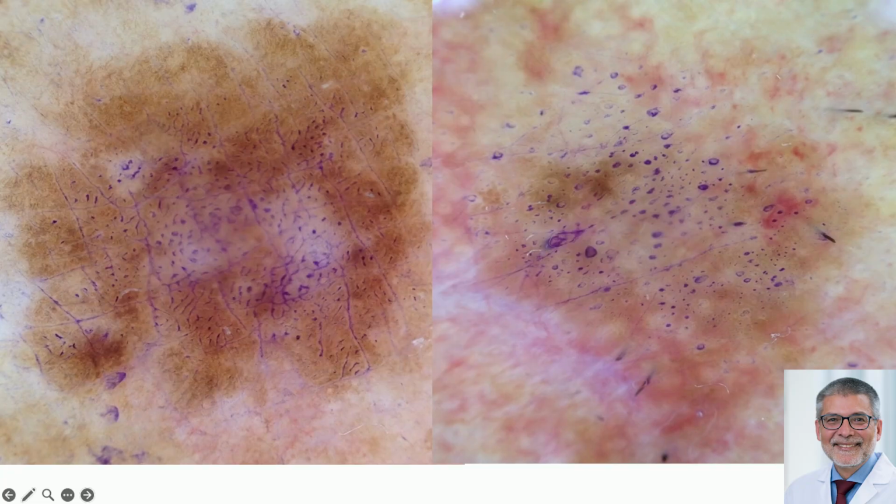To know that these are seborrheic keratoses. You would see these with your naked eye as well, okay, on side lighting. But it's just to show you that if you only rely on dermoscopy images without looking at the clinical, it can lead you to more biopsies than is needed.